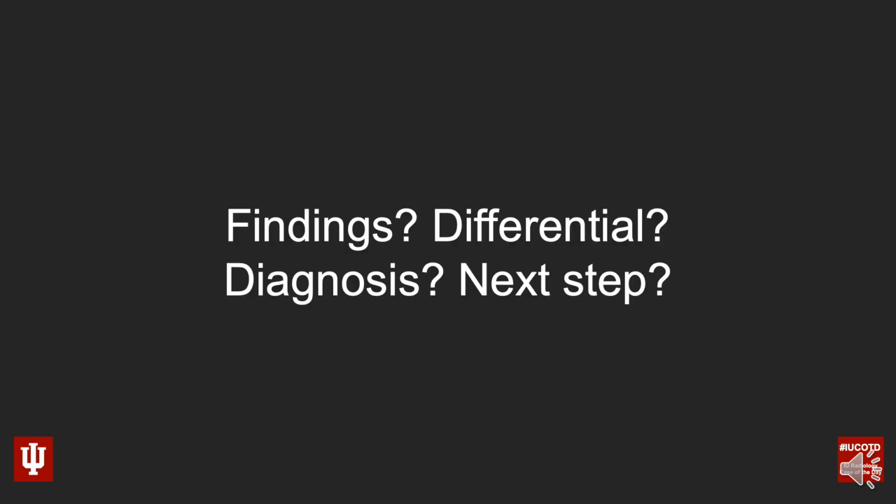Okay, so what are the findings? What's in your differential? What is the diagnosis? And what would be your next step?